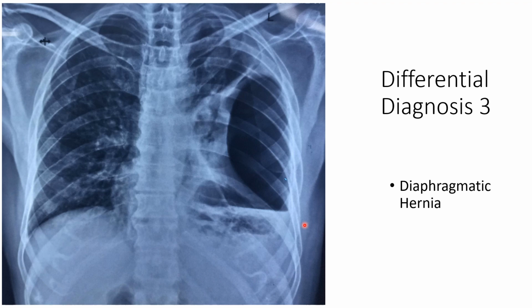In this X-ray, you have a hyperlucent and avascular area. There are no bronchovascular markings, right? It looks like pneumothorax, but then there is a straight line up here. There's a straight line here, and there are small straight lines here. If you see carefully, there is some straight line in this area. Then this also looks straight, and here also this looks straight.